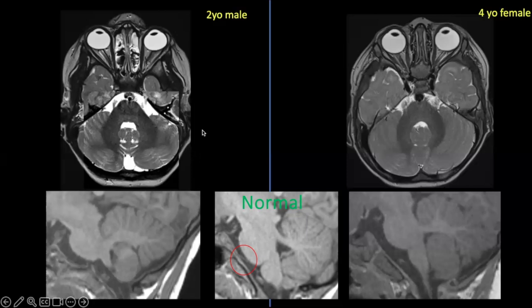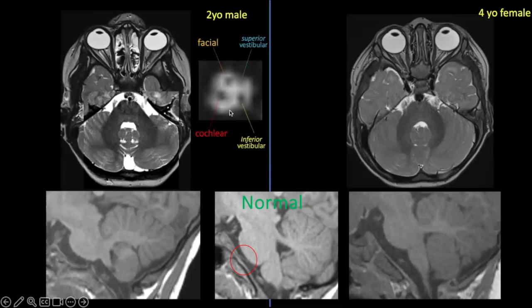Now, in the left case, we also see, looking at the other cranial nerves, that there are no other cranial nerves that are absent. We can see this is looking down the barrel of the internal auditory canal: anterior, posterior, superior, inferior. We see the facial nerve in the anterior superior part of the canal, the cochlear nerve in the anterior inferior part of the canal. This is your 7 up, Coke down appearance. The superior and inferior vestibular nerves posteriorly. So this is kind of a normal appearance.